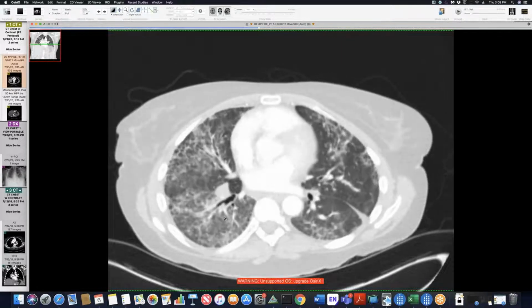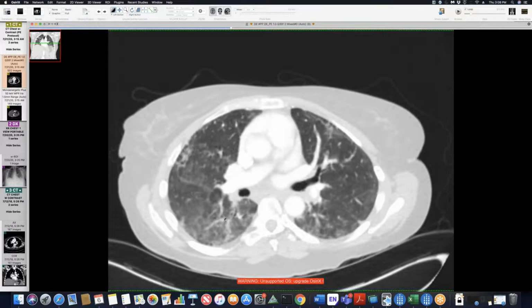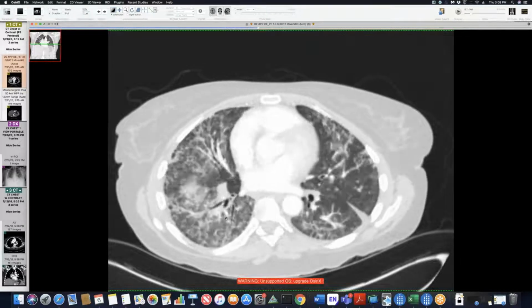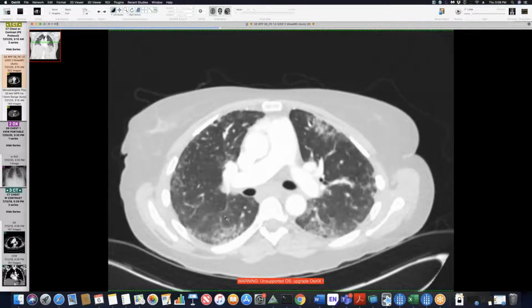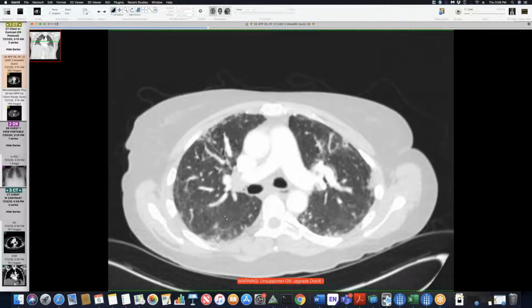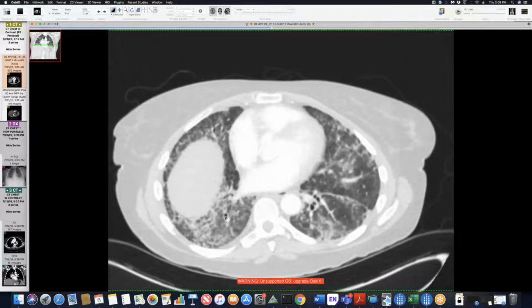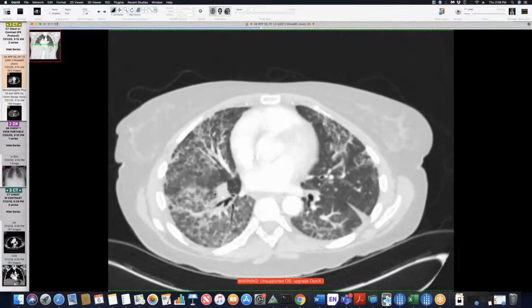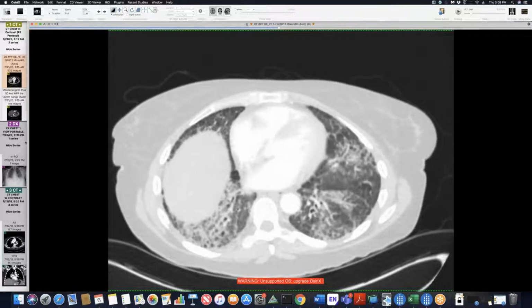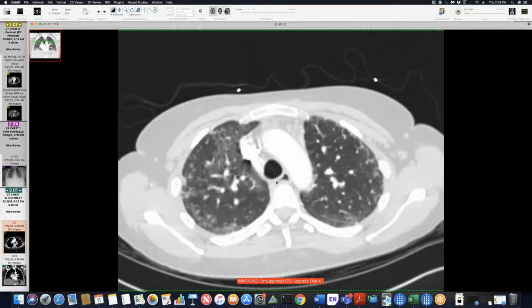So I had just read probably at least 4 or 5 COVID cases right before this one. So that's obviously the first thing I was worried about. The imaging pattern kind of looks like it could be that. The fact that it's getting so much worse at the lung bases doesn't completely fit with all the other COVID cases I've seen, but the best way to tell this wasn't COVID is the patient. You look back at the 2018 scan, and you can see abnormalities there.